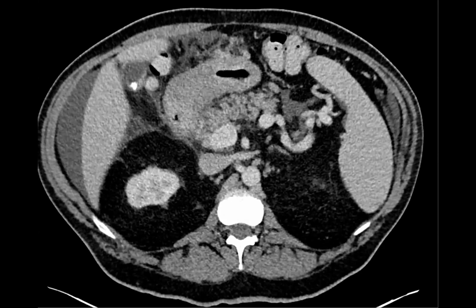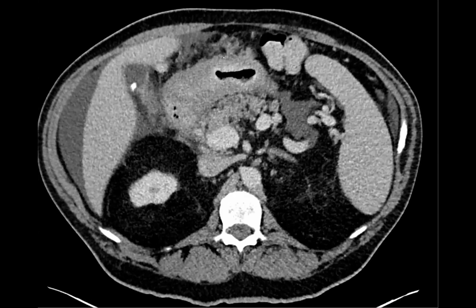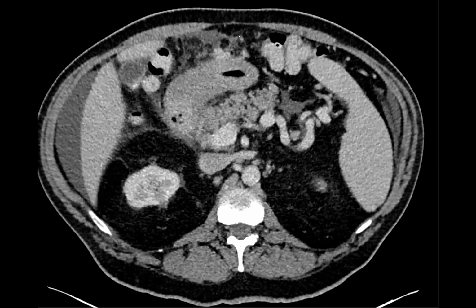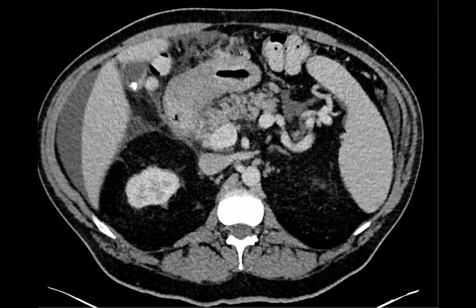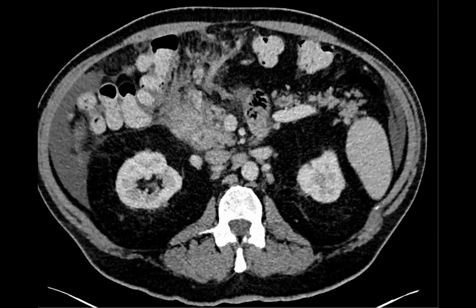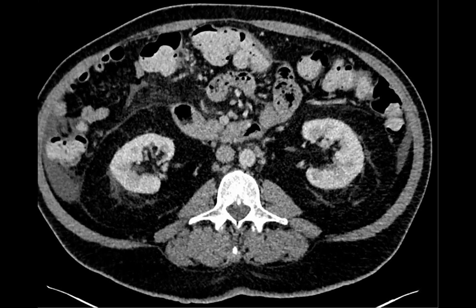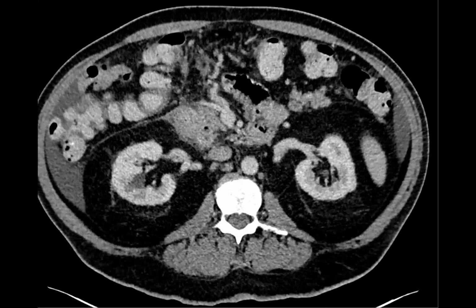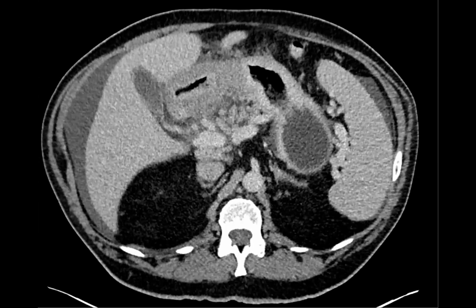Is there a carcinomatosis too? Sorry, maybe that was mentioned. Another point I was going to make is that right here you can see all this nodularity, right? But my surgeons have told me that when it's directly coming, like direct extension off of the stomach, we should not call it peritoneal carcinomatosis unless it was separate, if that makes sense. Because it can spread into the direct lymphatics adjacent to it, and that's not considered distant disease.